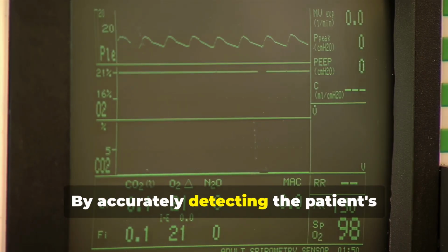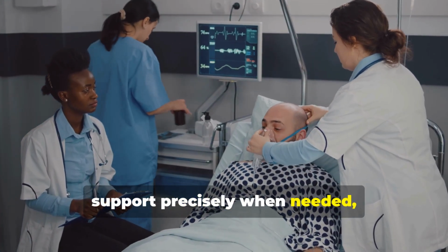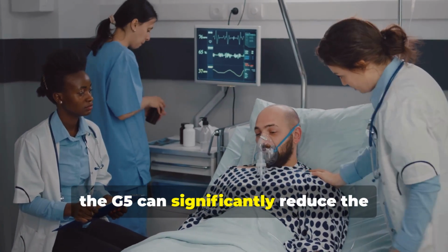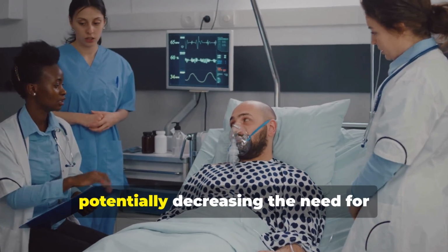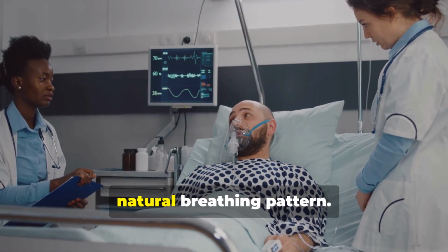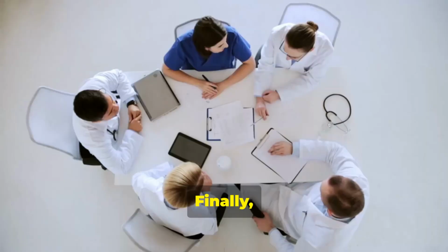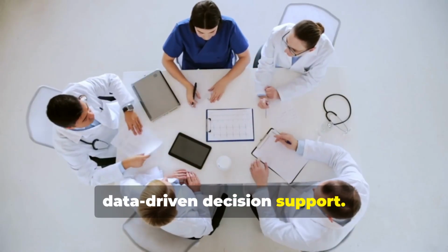By accurately detecting the patient's inspiratory effort and delivering support precisely when needed, the G5 can significantly reduce the work of breathing and improve comfort, potentially decreasing the need for heavy sedation and facilitating a more natural breathing pattern. Finally, the G5 provides powerful, data-driven decision support.